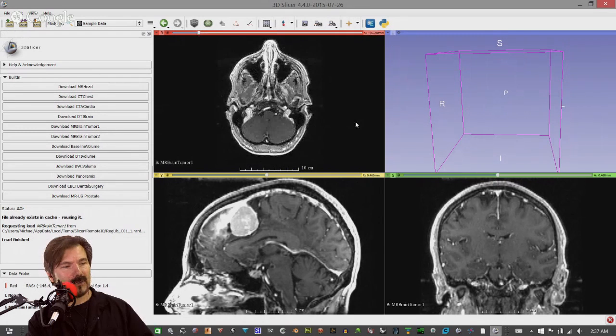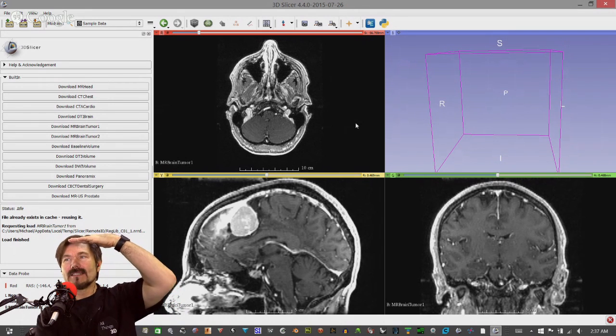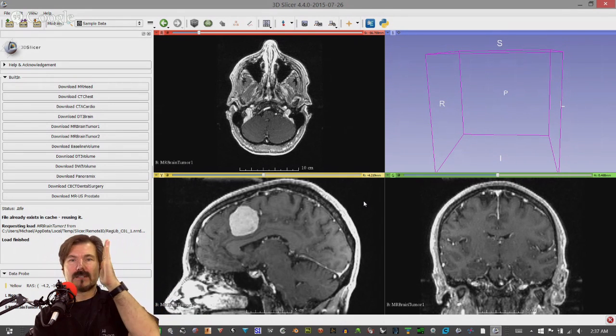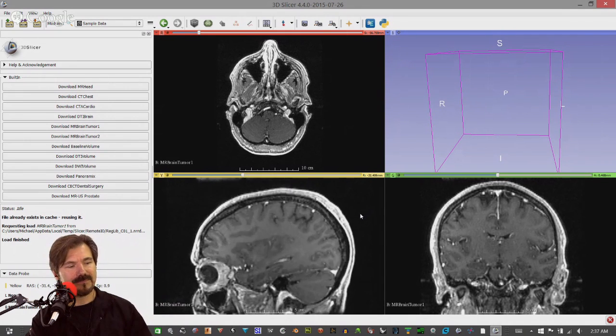And as you can see, as we move through, let's say in the top view, if you look at my head kind of going like this, imagine that's what it's doing. If I do this on the side, same thing, but it goes like this. So if you can imagine that occurring, that's essentially what we're doing.